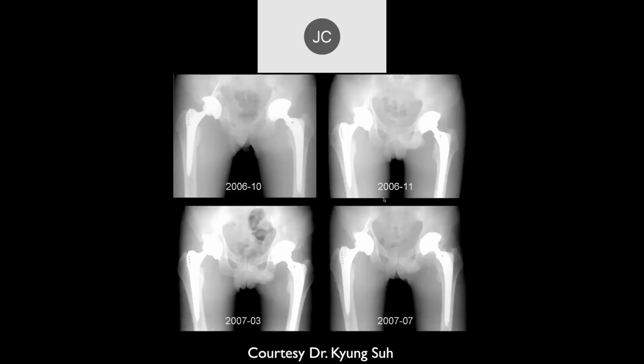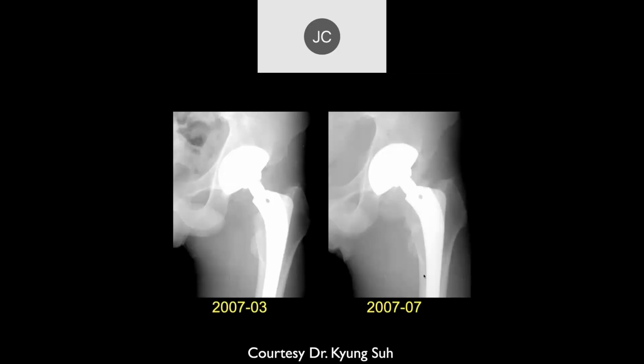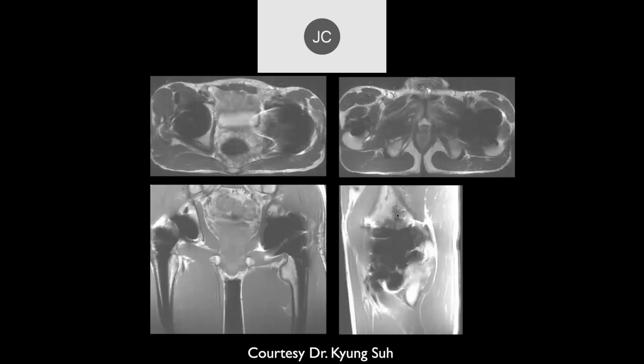Here's October, November, then we go to March and then July. Now I see some progression. There's a lot of extra calcification and heterotopic ossification there. Debris. Especially you can see it nicely here. Very asymmetric, not there really before. So we get progressive, really, what looks like calcified, dense, soft tissue here in the joint space. Here's what the MR scan looked like.